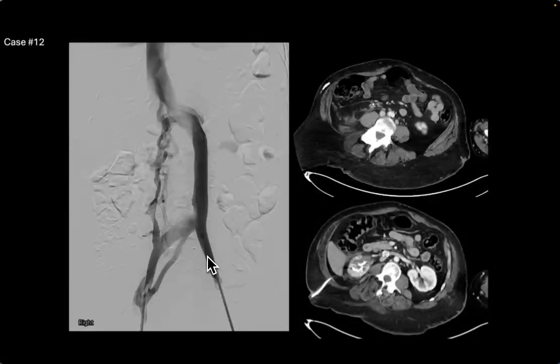basically a cavogram. This patient has a partially duplicated cava with a dominant left-sided cava here. So we're injecting, and here's basically what should be our iliac confluence, and it's just giving rise to this structure that's going up into this left renal vein and then draining into the system, and then we have this very vestigial right-sided IVC, which is where the cava normally should be. So this is kind of like a duplicated IVC. You can think of it that way.